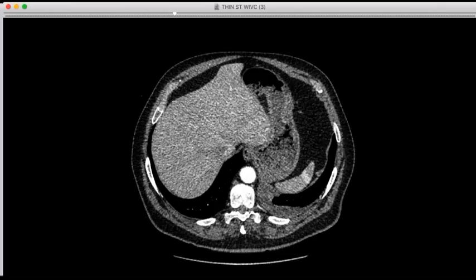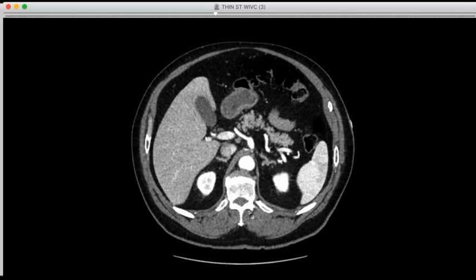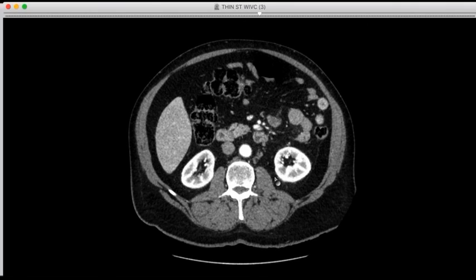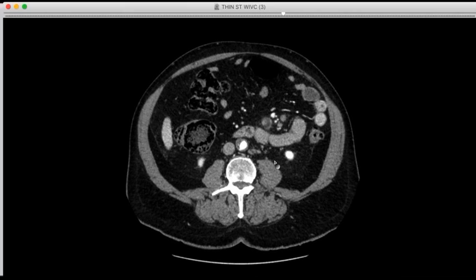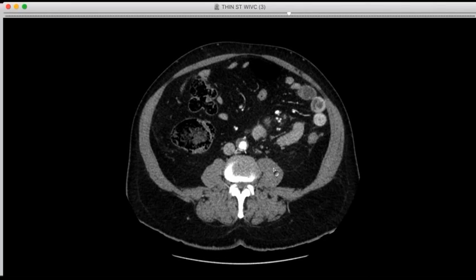So it looks like a metastatic lung cancer, pericardial effusion, and a small pleural effusion. But this patient was having, again, this vague back pain. And so looking at the rest, now we're in the abdomen phase, you'll see the image noise changed. And what was found was there's this necrotic mesenteric node here. And further down in that region, we see some other mesenteric nodes that are all large and necrotic. There's atheroma, but no acute aortic pathology.